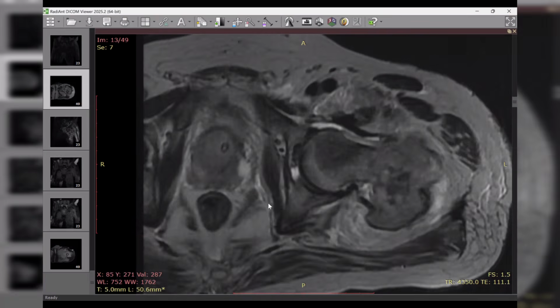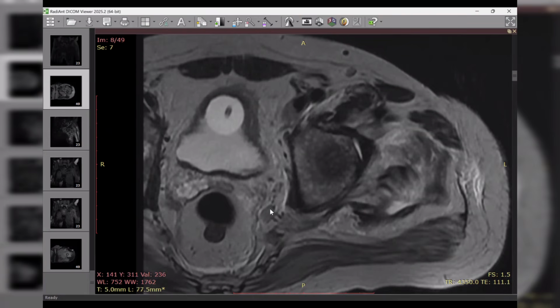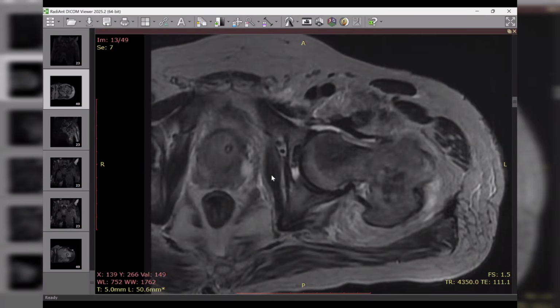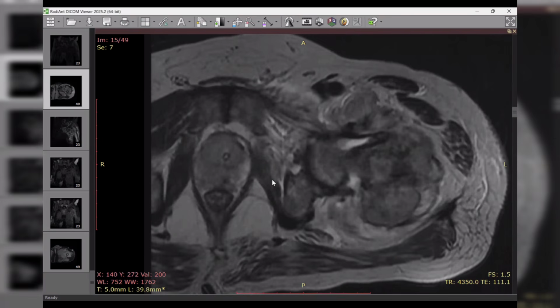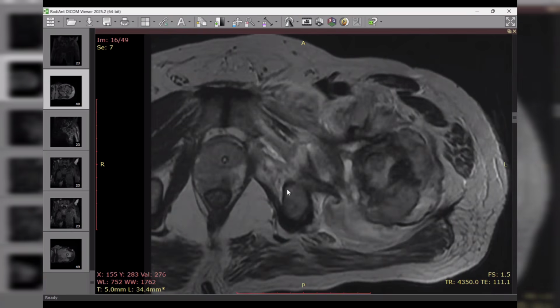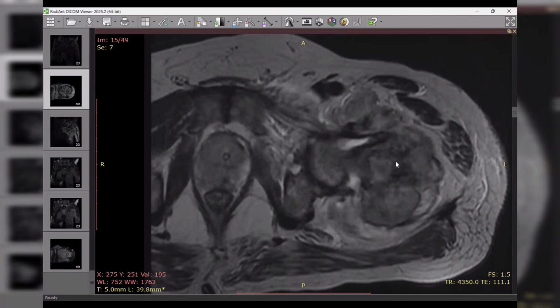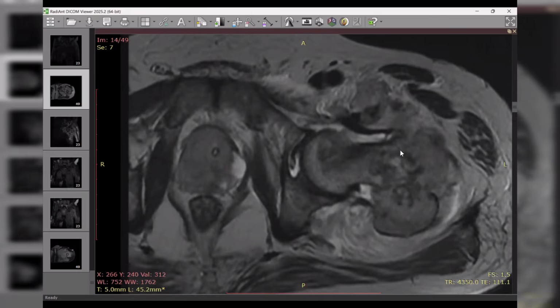If you see, like in this one, internal iliac and obturator lymph nodes, you know already you are dealing with a metastatic process. Either you check with CT chest, abdomen, pelvis, or you state this is an infiltrative metastatic process with pathological fracture. Okay. This is not a tough case, but it needs concentration on the bone marrow and on the periphery of the scan. Not all the scans will be for the pelvis. Suppose you have something like that, and you are already suspicious there is an expansion and infiltrative pathological marrow process, look for the prostate and look for the bladder. Okay?